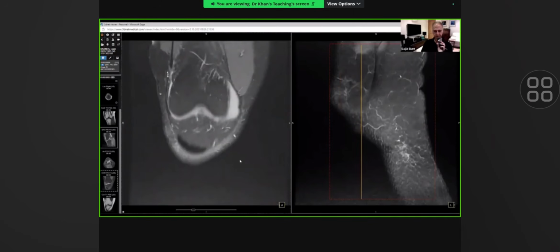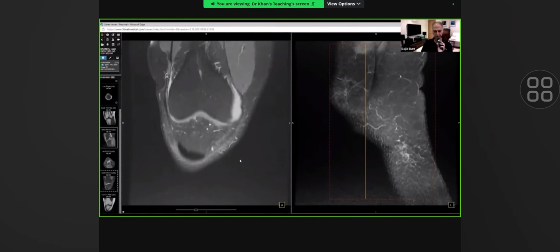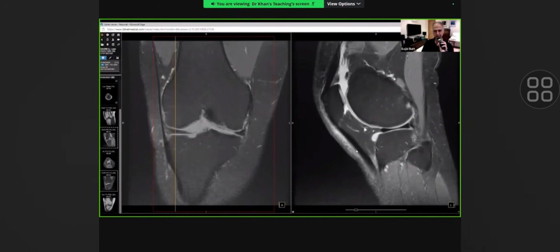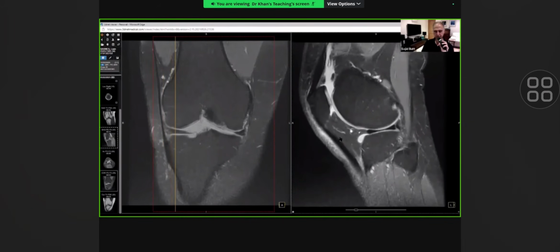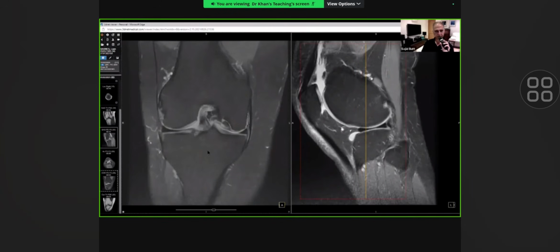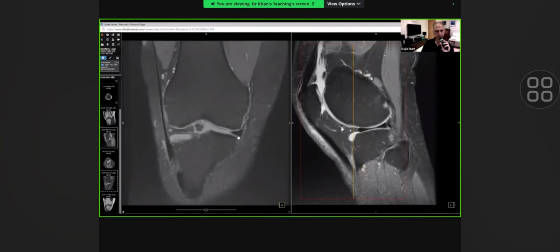So this patient is a 35 years old male patient, who complains of general discomfort for the last 1 to 2 years. Now the symptoms are getting worse. So these are real life cases, and these are the histories which were provided to me when I reported them. So right knee joint, remember 35 years old and 1 to 2 years history.